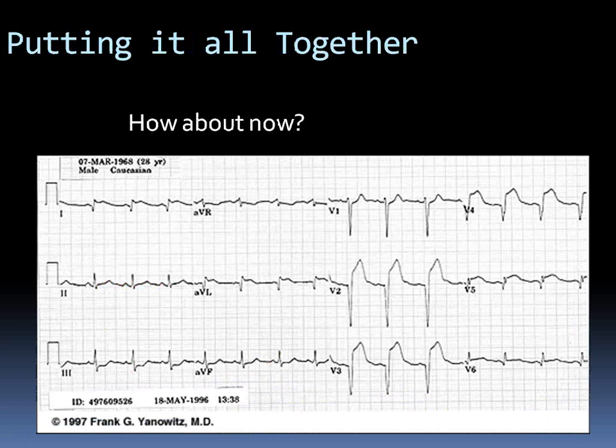Alright. Now, how about now? Where do you guys think you can see ST elevations in this EKG? Now this should be pretty obvious for you guys.